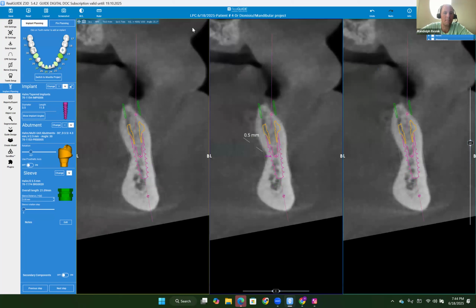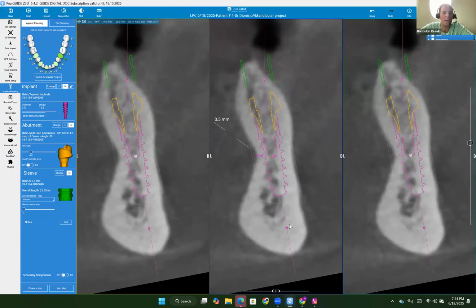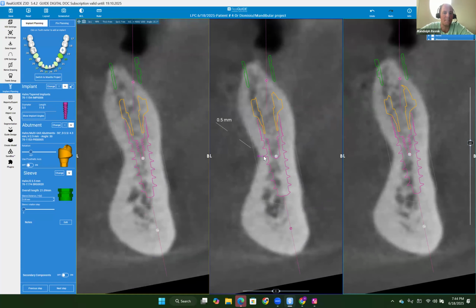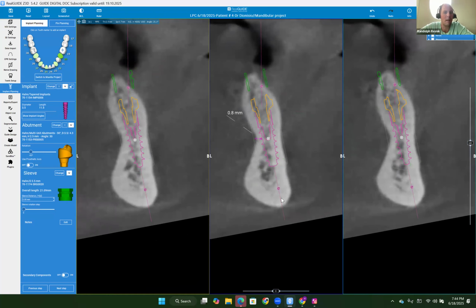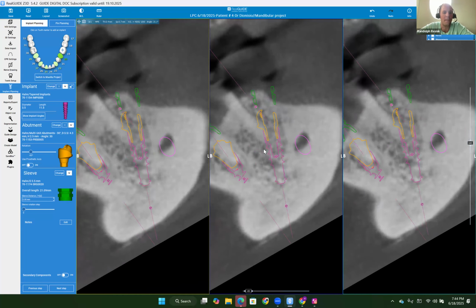So that's just going to take some modification from Dr. Hussein there. But the bottom looks a lot more favorable than the maxilla for the patient. So I think 5 implants down there will work out well for you. It's just playing around with this E position just to avoid that lingual concavity, where you may even have to place that one straight there, Hussein, just to avoid it there, which you can play around with.